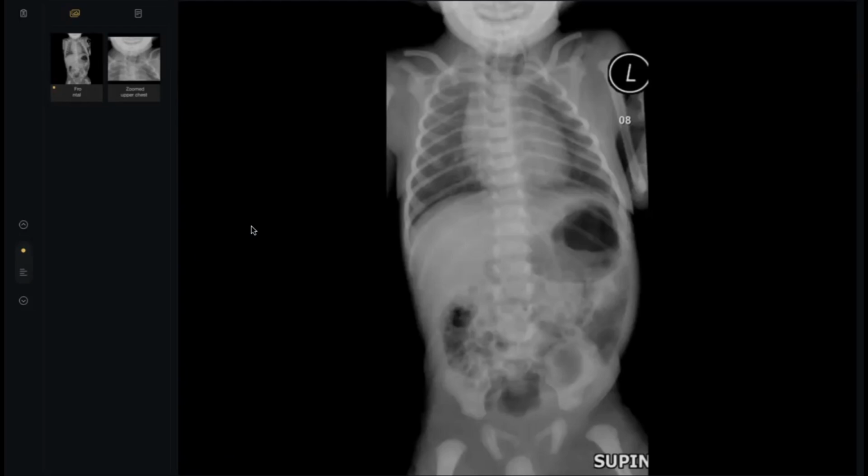It's going up. You get it. Do you remember? I told you, look at the neck, look at the chest, look at the abdomen. In the abdomen, two things you should exclude: either obstruction, whatever the type of obstruction, or necrotizing enterocolitis.